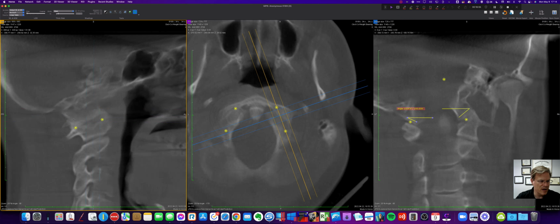But just for curiosity, we'll see that this is different. Let's go ahead and measure this over here now. This is not, again, part of the Blair procedure, but just for our interest. So we'll look at this later on the next, when we're measuring the left slope, we'll be looking at the right convergence. We'll see.